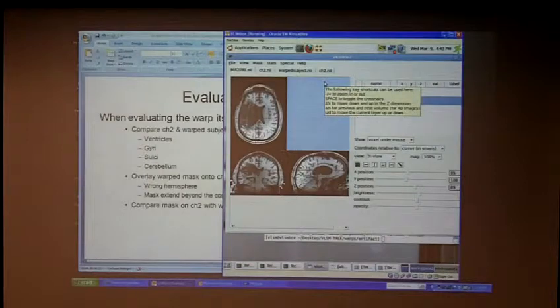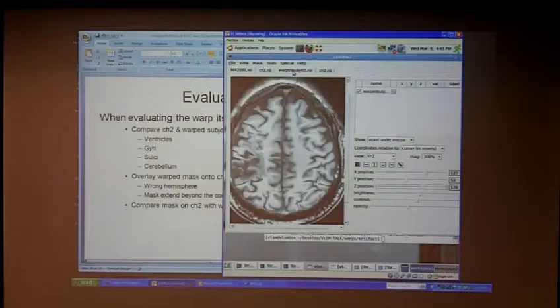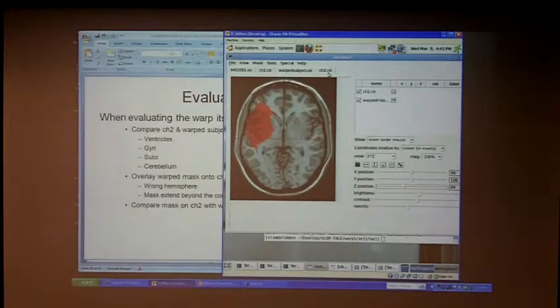I do think that it is still important to give that last check. But I tend to put more weight in these transformations, because essentially it's applying that same math to the mask itself. So if this looks pretty good, chances are this is going to be pretty good as well. What do you do if it looks bad?